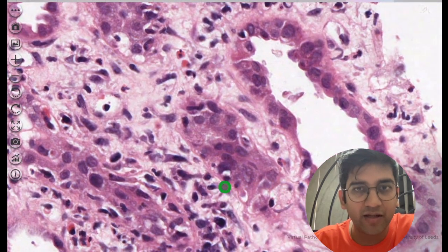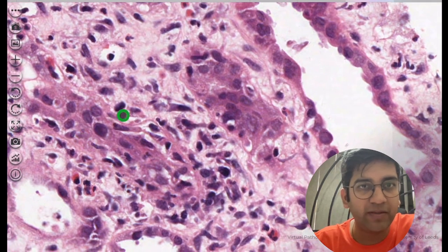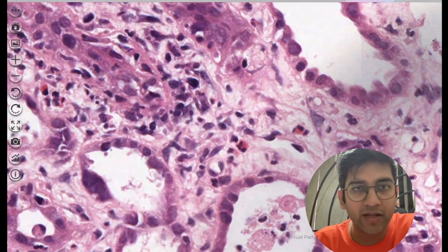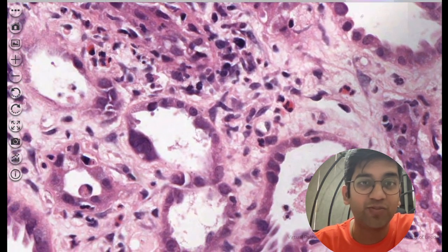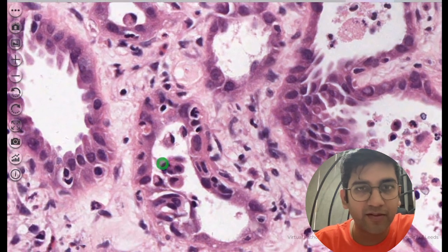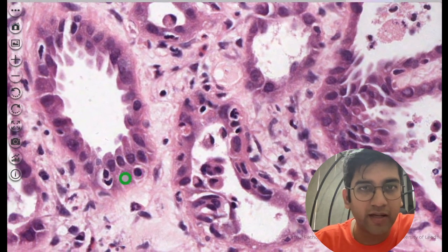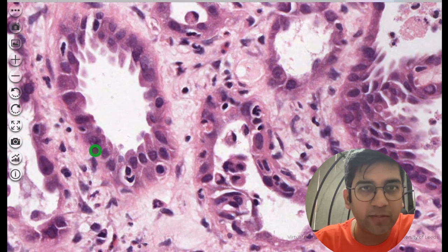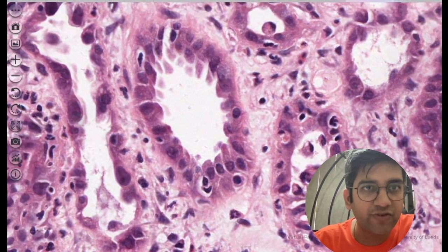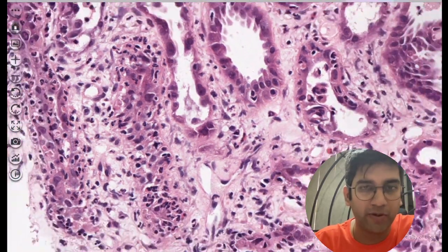That's all, right? Again, classical tubulitis going inside, kind of completely destroyed. The entire tube is kind of completely destroyed, right? Okay, look at this. Such huge, smudged nuclei, right? And definitely it's smudged but it should have inclusion bodies by default. Okay, so look at this. Clearing is there, right? I hope you can appreciate this clearing. Again, tubulitis here. You can see a little bit of smudging here, right? So all these are suspicious of a polyomavirus nephropathy, right?